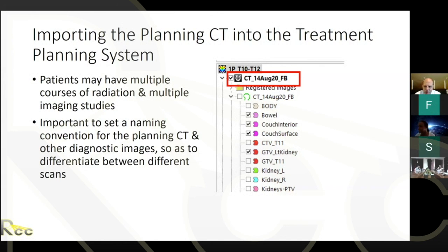That goes to the treatment, I'm sure, like when we discuss treatment planning, but typically you put it in the center of the PTV. The only reason not to do that is sometimes, let's say you're treating something really far to one side or the other, you may run into some collision issues. So you may want to just be aware of that. For instance, if you're using arc treatment and you're treating something really far to the side, you may not be able to do a full arc. So you may want to put it more central. But I think it's very standard practice to put it in the center of the PTV. That way it's always kind of what to expect, with all the planners doing it the same, and there's a lot of value in that.